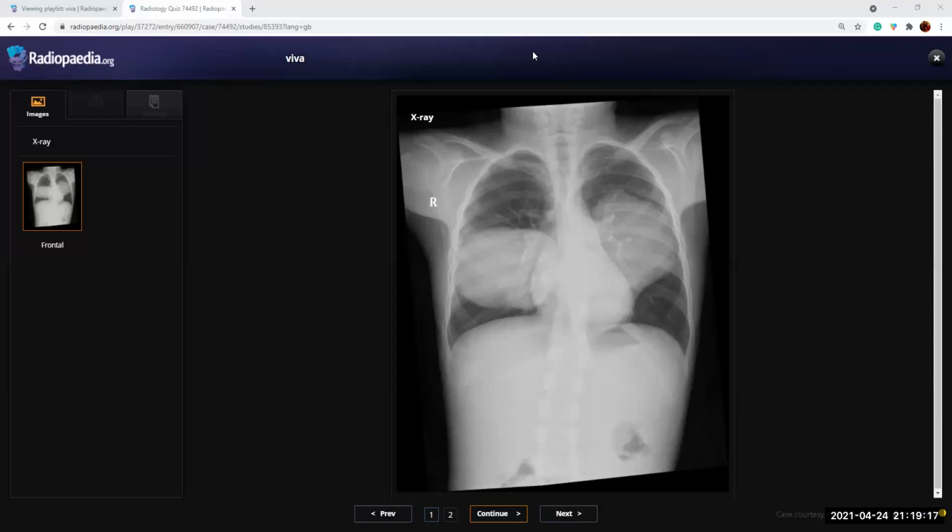No. So this could be, actually, maybe a posteriorly located mediastinal lesion is also a possibility, because I can see the cardiac borders clearly, and I'm looking at the spine, and I could not see clearly any spinal pathology. The right lung, what kind of margins is it forming with the mediastinum? The lesion on the right, it's forming acute margins with the mediastinum.